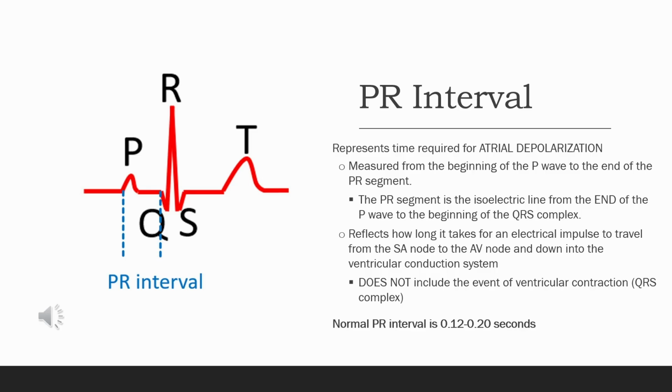Understanding the PR interval and how it can change is especially important when we start to learn about AV heart blocks, which is covered in level 4.